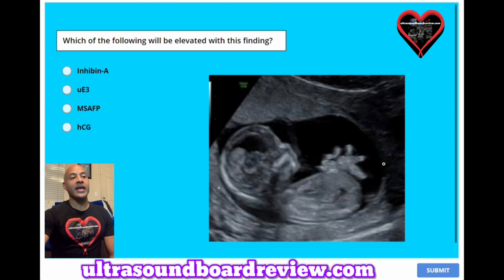This is a fetus with gastroschisis, and this will cause a rise of AFP, so your MSAFP will be elevated. Remember, MSAFP and AFP are the same thing. MSAFP is just the lab test, and AFP is the elevated enzymes in the body.